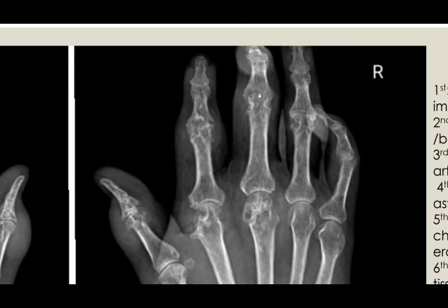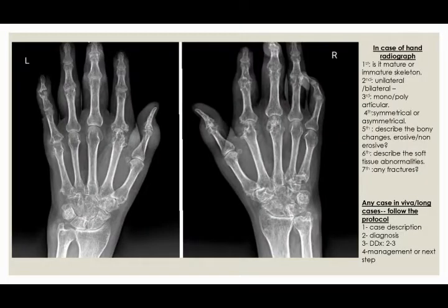Either it's lost in some of those joints. There is also multiple periarticular dense soft tissue swelling around the proximal interphalangeal joints of both hands, around the metacarpophalangeal joints, around the interphalangeal joint of the thumb bilaterally, and we can see them near the styloid process of both hands.